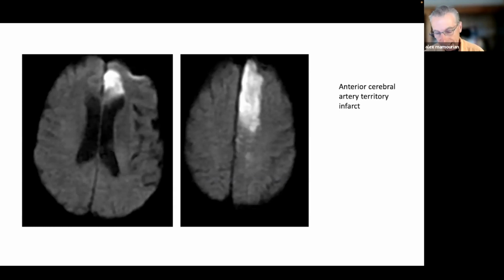This, of course, is the anterior cerebral artery territory, and this is an MR diffusion scan. So you see this high signal intensity, which indicates we have restricted diffusion. The anterior cerebral territory comes to the midline. It hugs the midline, has this relatively sharp border here. This would be the distinction here between the anterior cerebral and the middle cerebral artery territories. Depending on the exact vascular anatomy, it may come farther back than this, a complete anterior cerebral infarct, or this one is truncated here.